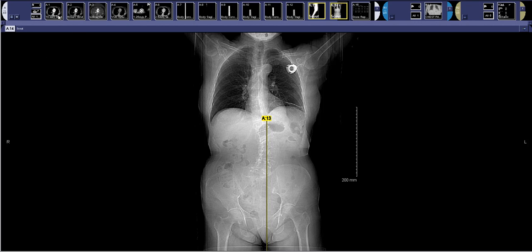Additionally, you'll notice up here that we have those 70 keV, 50 keV, and iodine maps typical of a dual energy scan, because many institutions, including our own, do a pancreas protocol CT scan with dual energy to help try and see the pancreatic tumor, which can be very difficult to detect, especially if it's found early.